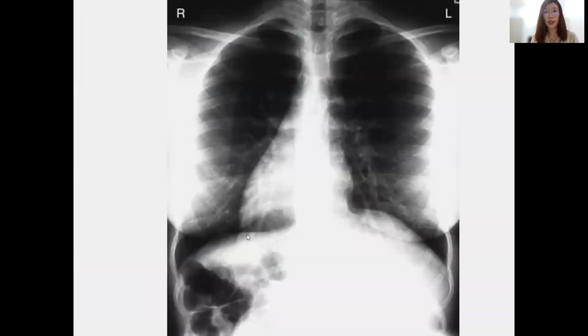So first of all, this X-ray is showing dextrocardia, because the markers are correct, left and right, they specifically labelled it. So if it's not, I will always check with the radiographer whether there was any rotation or mirror imaging while doing the X-ray. Always check with them. Okay.